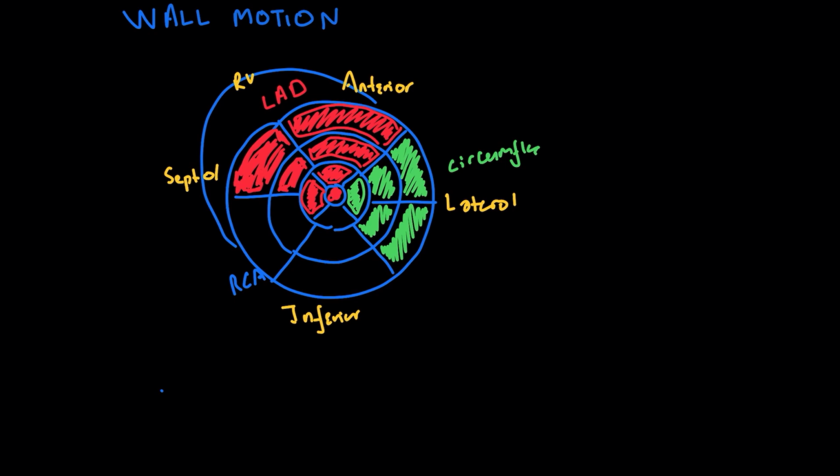How do we do that? Well, I'm going to take this yellow line here. The one that's probably easiest to understand and remember is if I slice right through anterior to inferior, and I look at what we have here, that actually corresponds to your 2-chamber view with your left atrium emptying into your left ventricle. And you've got this right here would be the anterior wall, and this would be your inferior wall.